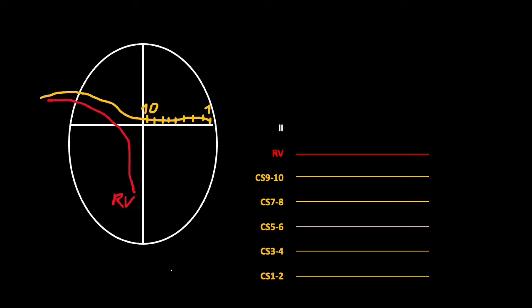Hello. In this short video, I would like to discuss the idea of incremental pacing. Incremental pacing from atrium and ventricle are the most basic maneuvers during the electrophysiological study. Typically, during EPS, I start incremental pacing from ventricle.